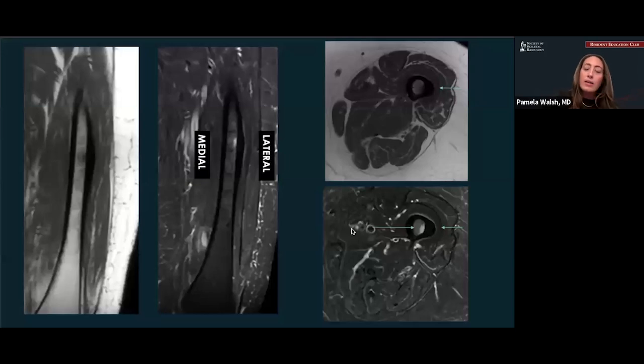And then here's an MRI of that patient prior to fracturing. So we see it's very subtle with this cortical thickening. And I actually think the edema-like signal is pretty unimpressive, but I think it's important to note that there is edema there, and that's still quite concerning for an impending fracture.